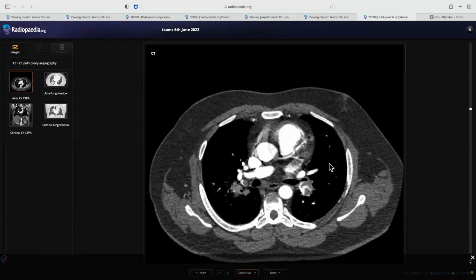So what do you see on CT? You see right ventricular dilatation, and the cardiac septum will be deviated to the left side, and we will see, in the upper abdominal cuts, reflux of the contrast into the IVC. Okay.